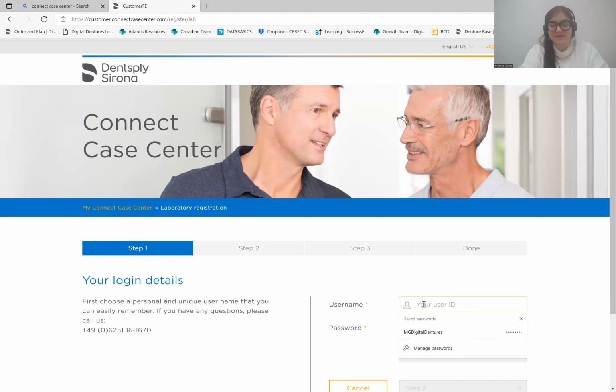So you're going to choose a lab name. Okay, so you can just choose whatever name you want. If it does say that it's already taken, you just have to choose something else.